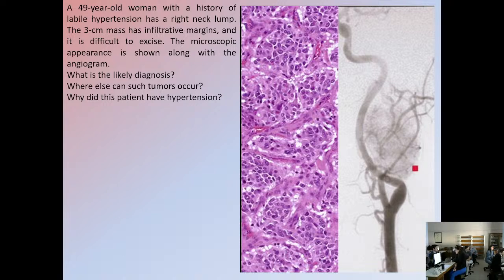Do they appear benign or malignant with regard to their nuclear characteristics? What do you think? Do the neoplastic cells look like each other, or do they differ from each other? What do you think? They look like each other. So it's possibly a benign neoplasm. And remember what we said from the previous semester. If a neoplastic lesion consists of homogeneously appearing cells, what differentiation is suspected?